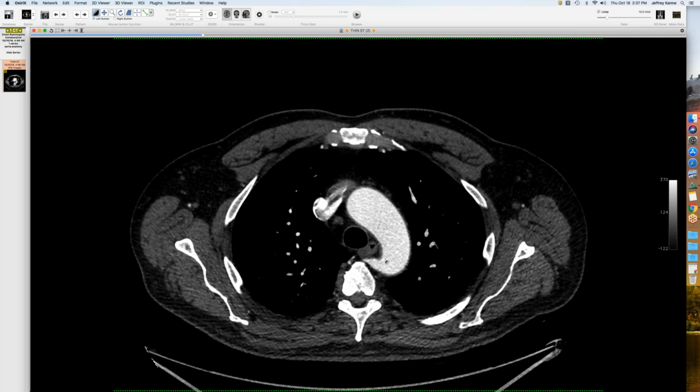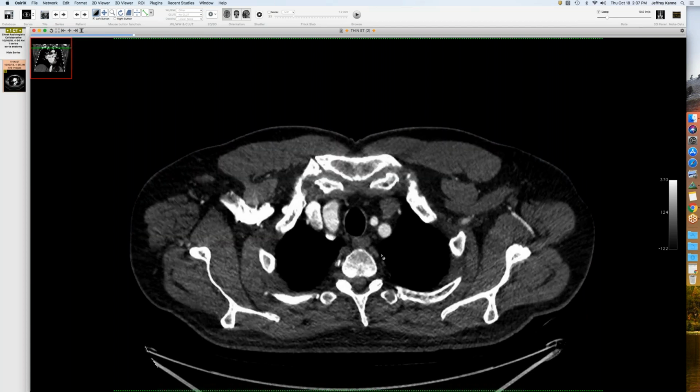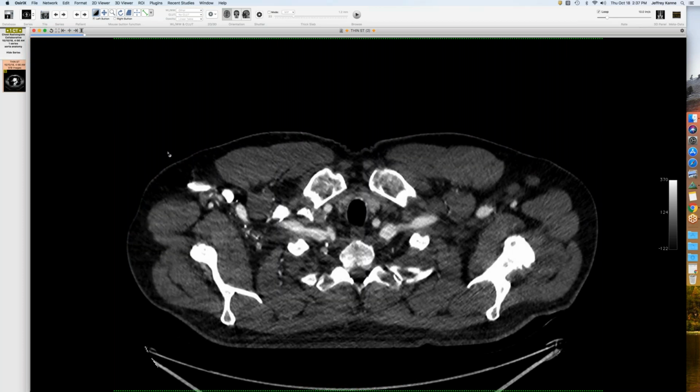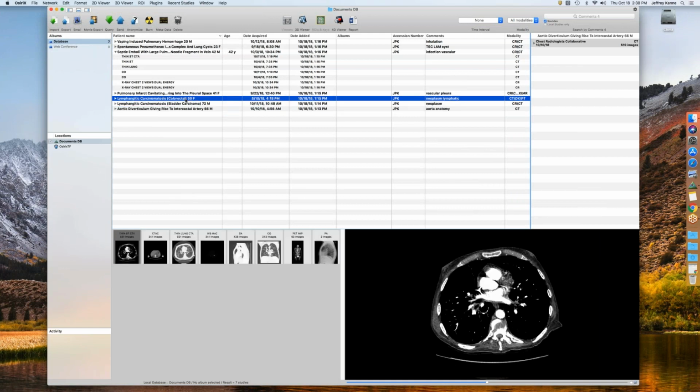Yeah, I thought you were going to go with the right vertebral artery. Does the patient have a right vertebral artery? Good question. Comes off normally? Yep, there it is right there. Huh. Just one of those things, add it to our list of aortic anomalies.